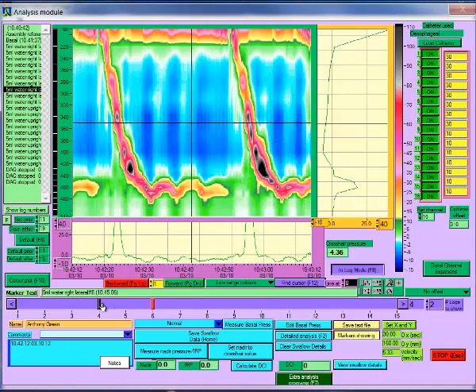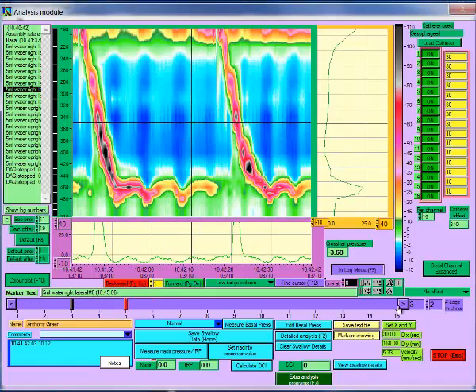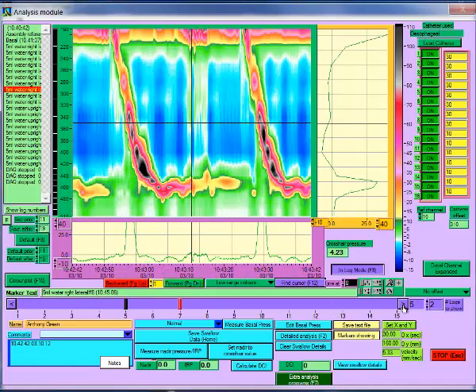Alternatively, you can click on the purple bar or use the arrows at each end to move forward or backward by the number of data logs shown in the yellow control. You can change back to marker mode by clicking on one of the markers in the text box, or by clicking on the In Log Mode button, which will revert to In Marker Mode.